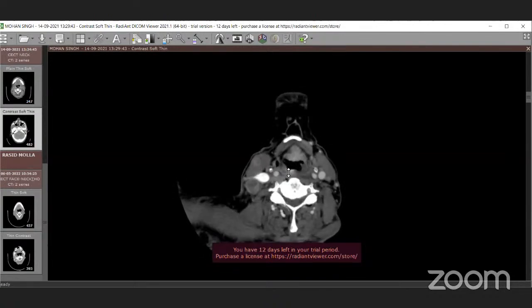If you cannot see this line, then there might be disease extension. If there is a tumor in the paraglottic space that infiltrates the infrahyoid strap muscles, then there is extralaryngeal extension of the tumor across this.